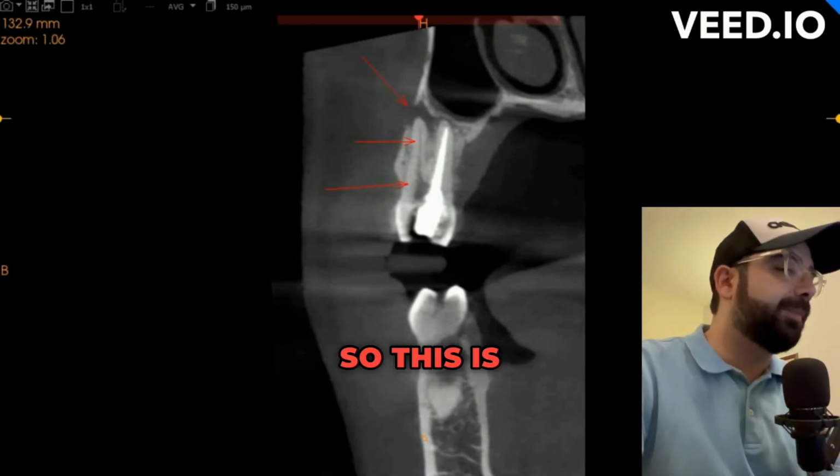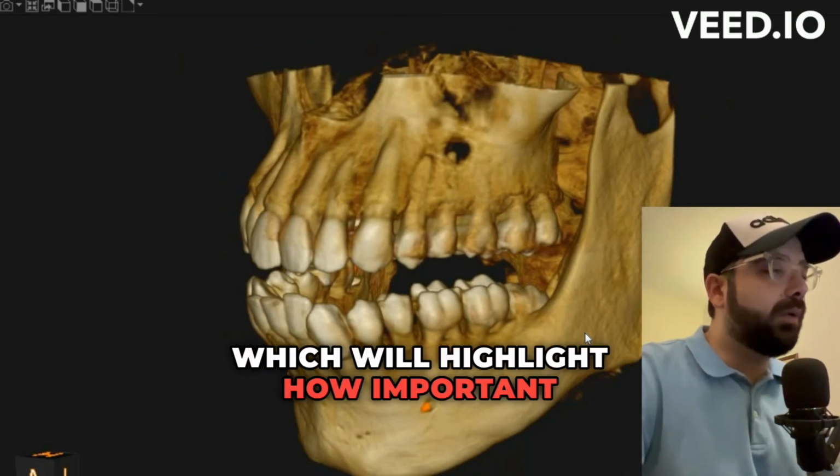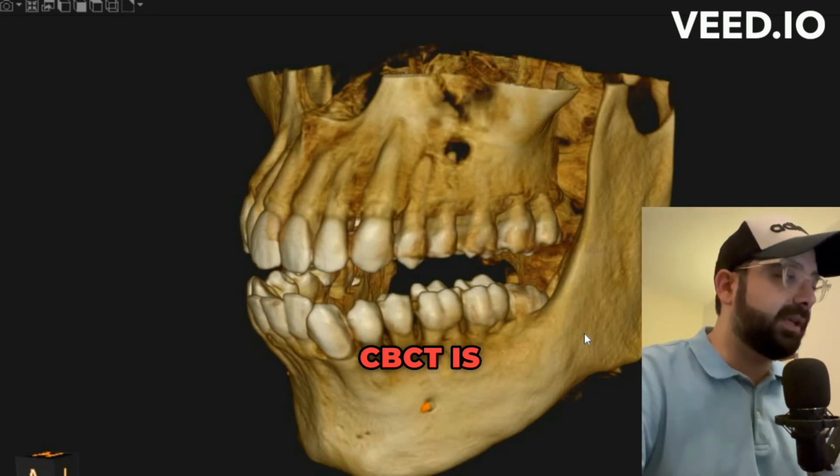So this is a very, very important case, which will highlight how important 3D imaging, CBCT, is in dentistry.